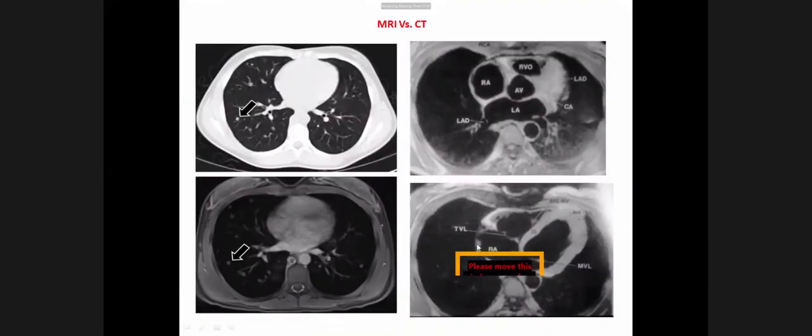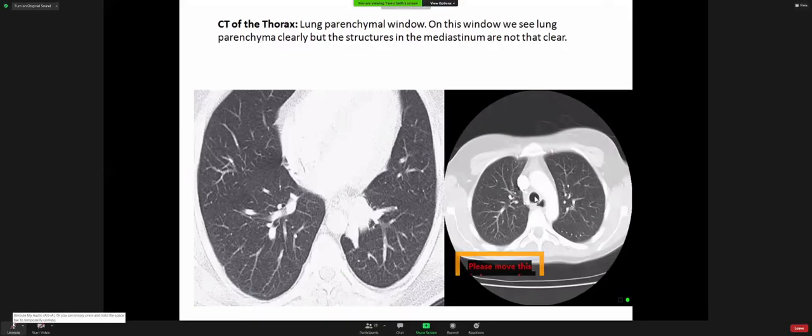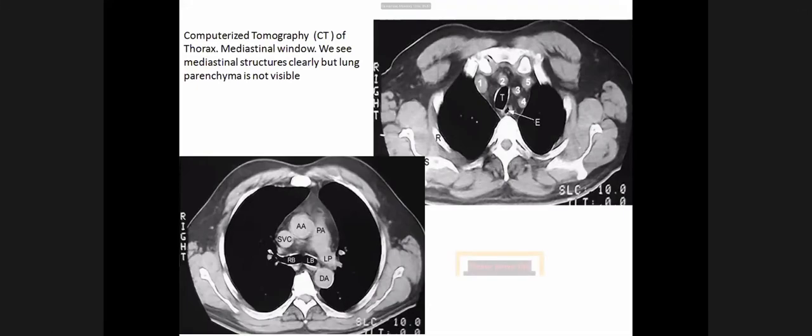Again, you have to know, in addition to this one, what is this? Trachea. Yes, this is right and left lung. This is all you may be asked about in the hospital. No more than this. It is easy to score a full mark, all of you.